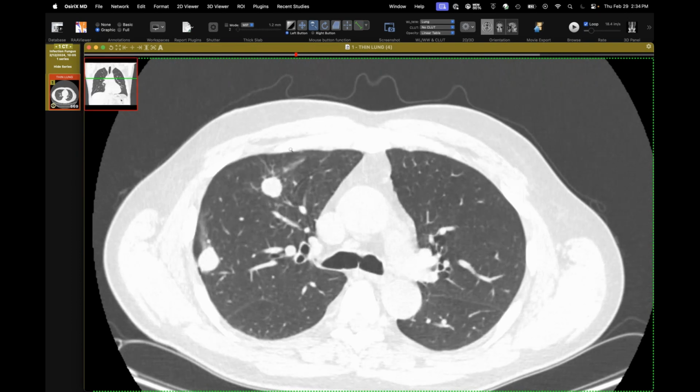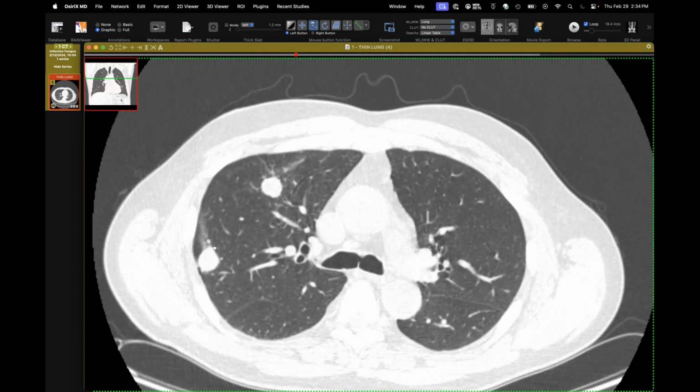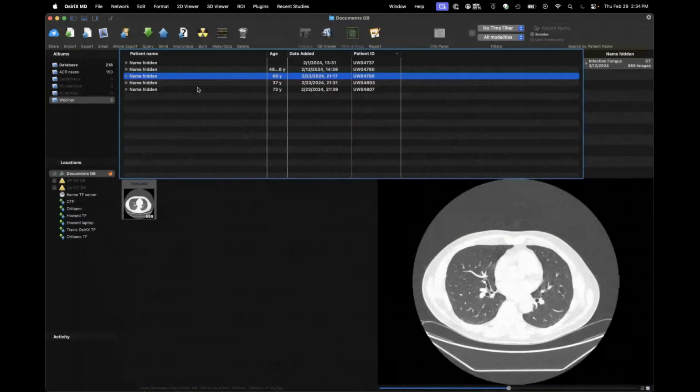to a granulomatous cause. And so there was a nice talk on histo at the STR this week, and they described this appearance. I think someone used the term frogs on a log. I've heard ants on a log, but it's probably the tiny lymph nodes and stuff. As the organism is ingested by macrophages, they drain along the pulmonary lymphatics. But usually with histo, you get quite exuberant lymphadenopathy.